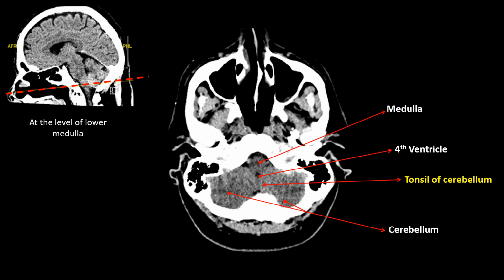Tonsillar herniation is often called coning. If it herniates through the foramen magnum, it causes compression of the medulla, leading to respiratory arrest and may be typically rapidly fatal. Compression of the fourth ventricle may also result into obstructive hydrocephalus.